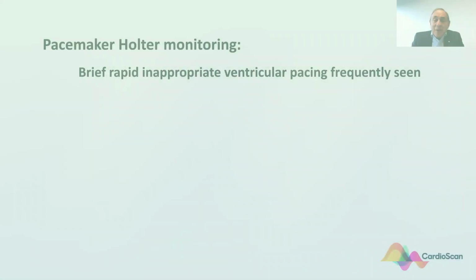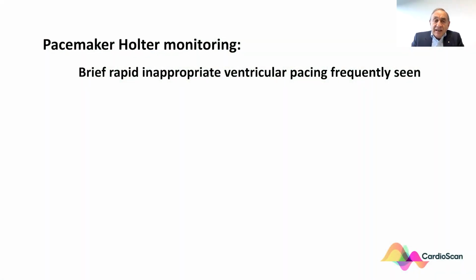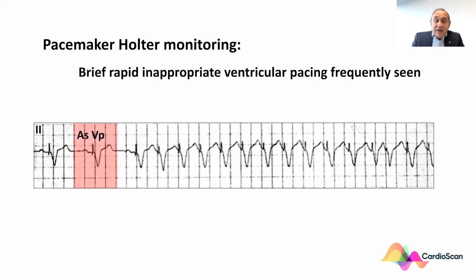When one does a pacemaker Holter monitor, we often see brief, rapid, inappropriate ventricular pacing and wonder what is the cause of this. In most cases, of course, it's going to be short runs of supraventricular tachycardia in patients with a dual chamber pacing system. Here is such an example.